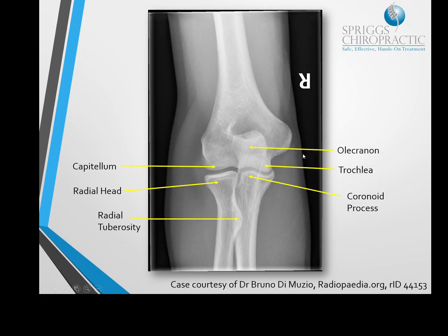Then you've got the olecranon, which is obviously back here, just here. This is superimposed by the distal humerus, which is making it very difficult to see. However, its location is important when you're reviewing normal anatomy, because ultimately it needs to articulate with the trochlea, but also the olecranon will slot into the olecranon fossa. So up here we've got the superimposition, this dark area just here, which kind of looks like a bowl if you hallucinate it for a moment.